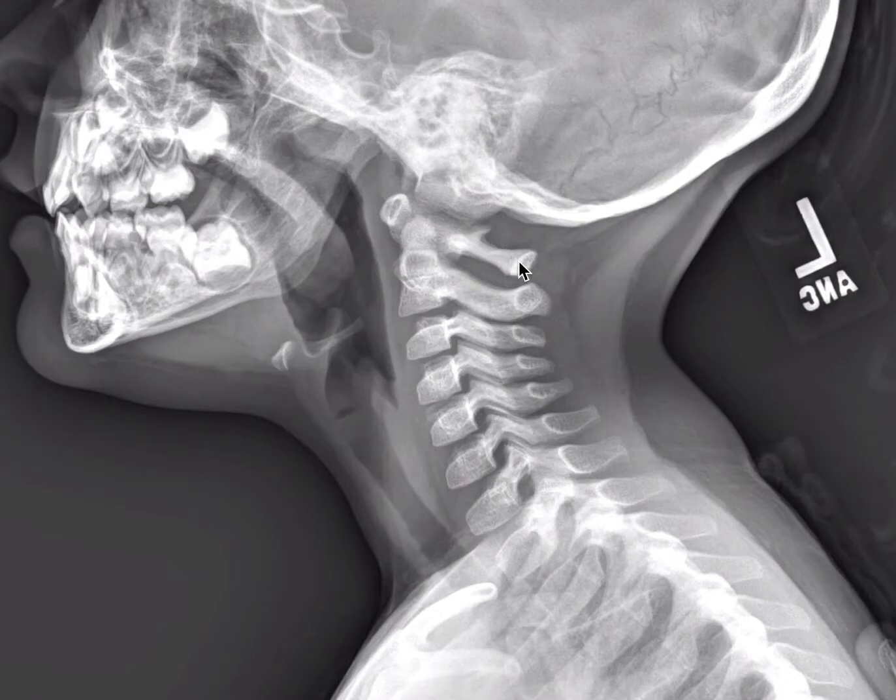Third, the spinal laminar line. The spinal laminar line runs here along the posterior margin of the spinal canal, along the anterior aspects of the posterior arches. The density that we see right here and along each cervical segment is from the point where the laminae are converging at the spinous process. This increased density here gives us the landmark to connect the different points along the spinal laminar line.